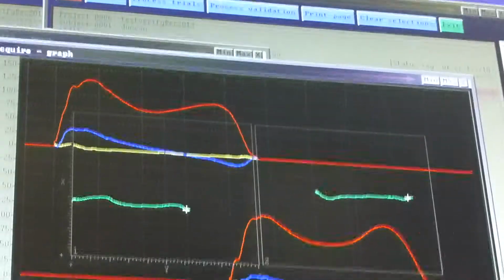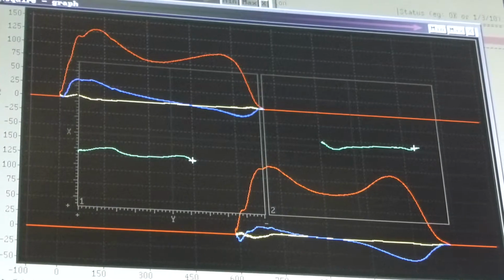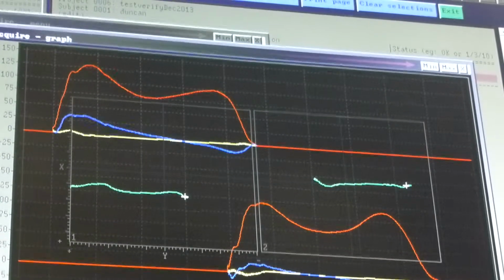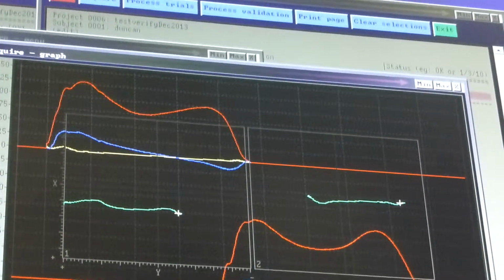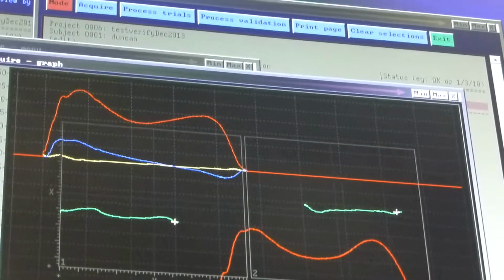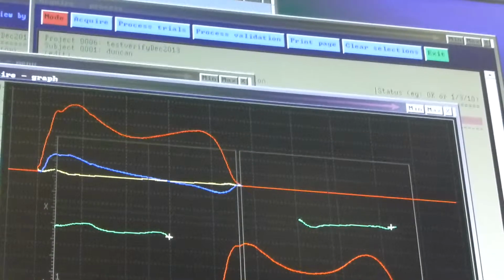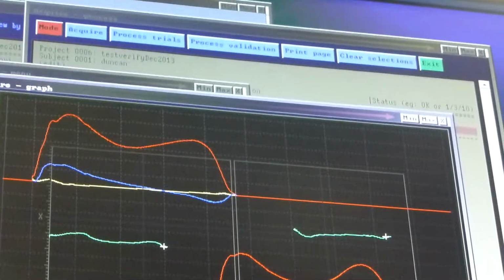So this is good. I'm looking at my screen here, and the box on the left is box 1, on the right is box 2. But the little X's are to the right side of each box, within the box, and the green line trails off to the left. I know what direction I walked in, so that would suggest we have force plate 2 on the left as I look at it, and 1 on the right. Would that make sense?